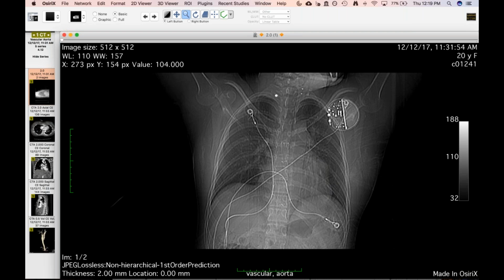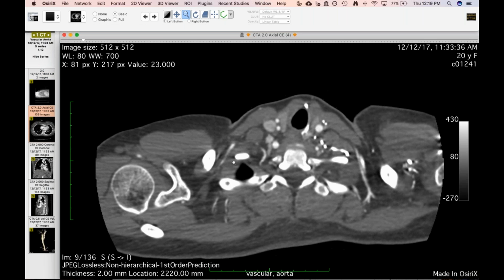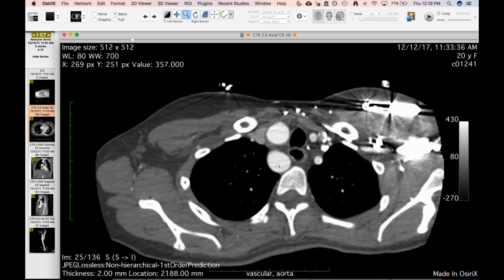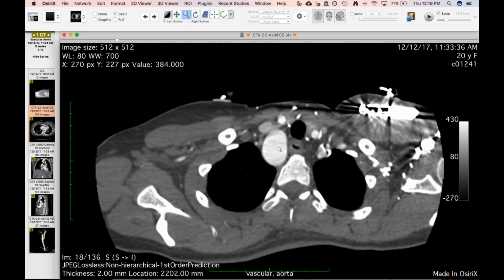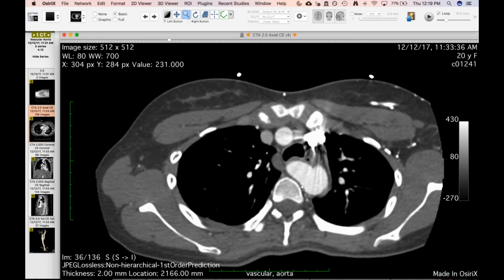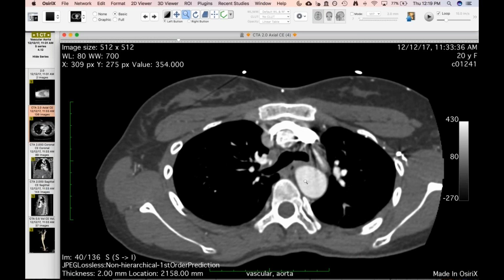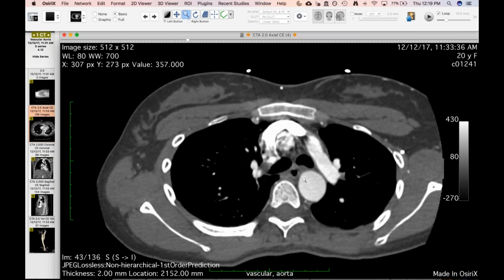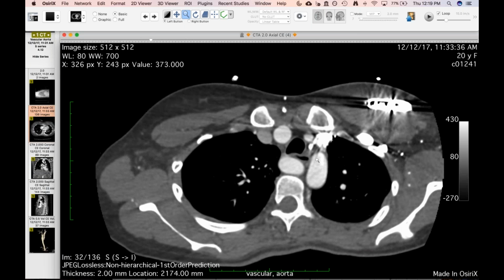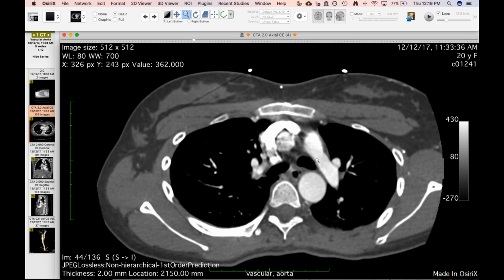Looks like she has a left arch here, but then you see there's this higher right paratracheal abnormality, and the trachea looks like it's a little deviated to the left, but it's quite an impressive CT when you see it, that her arch is right-sided and extremely high. And she has, as in the case you showed either last week or the week before, the circumflex descending aortic arch that descends on the left side, and the left subclavian comes off of the descending, so it's an aberrant subclavian as well.